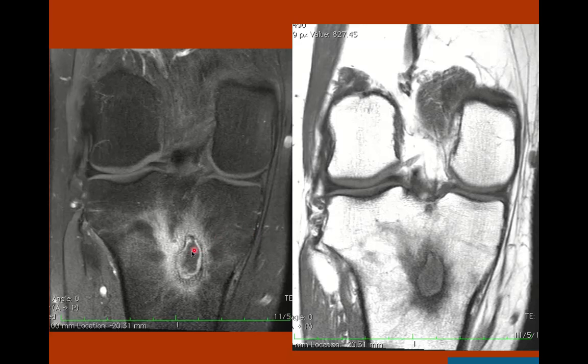The first level or first ring, the central aspect of the lesion, shows low T1 and high T2 signal intensity with no enhancement and is related to pus and necrotic tissue. The second level or second ring is a region of thin, high T1, low T2 and enhancing region related to granulation tissue, and this is called the penumbra sign. The penumbra sign is characteristic for subacute osteomyelitis.